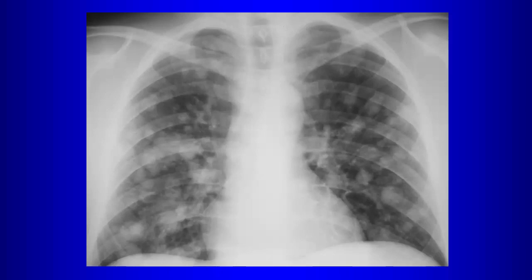Mets. All right, so the first thought is going to be metastatic disease. Is there anything else that might give you multiple nodules besides metastatic disease? TB, although usually not so well circumscribed, they tend to be smaller. Sarcoid, not this big. No, that's usually not as diffuse. There you might expect to see some cavitation.